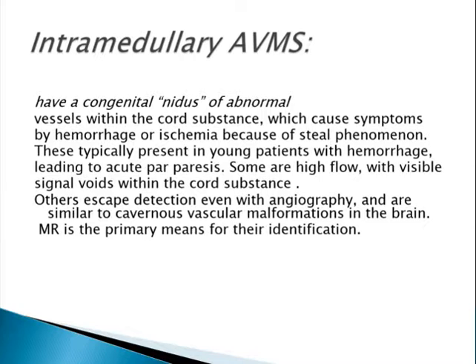The others, if they are small enough, might escape detection even with angiography, and they are similar to cavernous vascular malformation of the brain. And of course, here MR is the primary means for their identification.